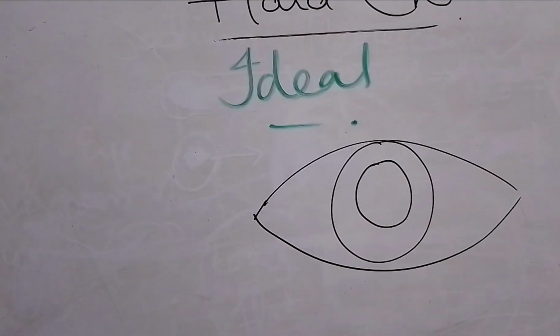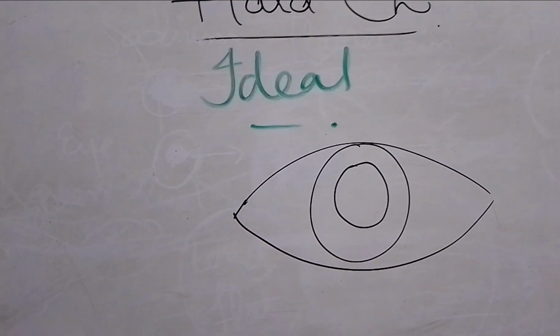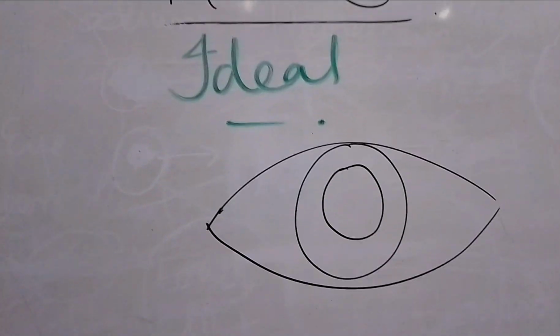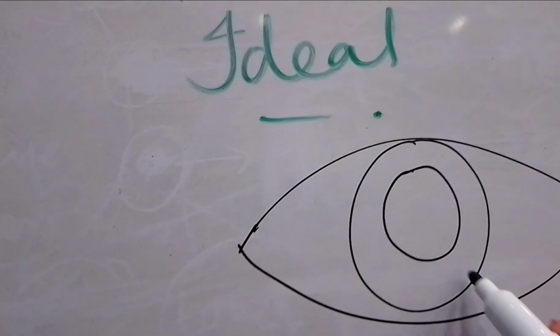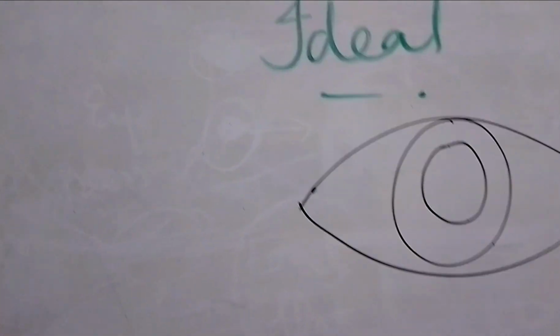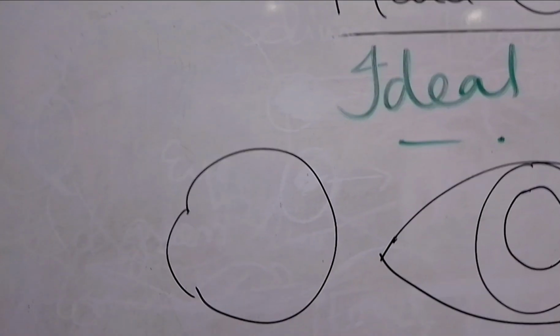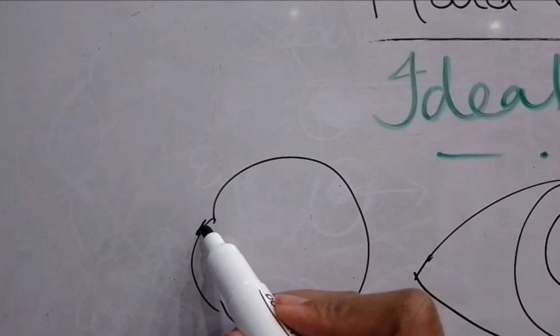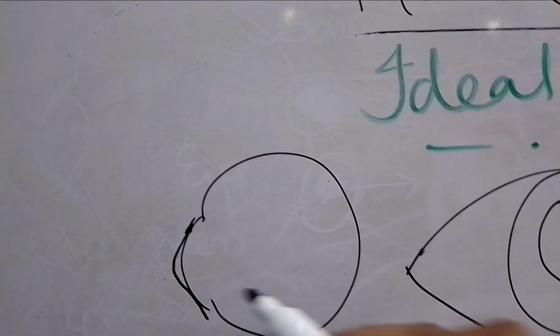So the hard contact lenses are located slightly raised, right? So here, you are going to see the pattern in such a manner that here is an eye and this is a cornea and this is the contact lens, right? So what does ideal fit mean? Ideal fit means that they should not touch, there should be no peripheral touch, okay, but there should be a mid touch, and then it should not be touching the center.